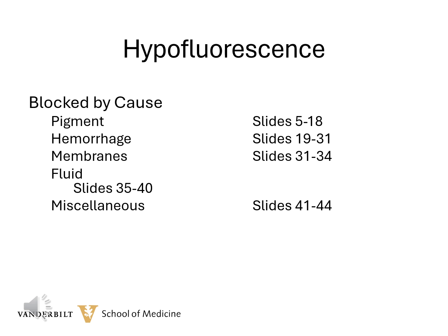So this portion of the atlas on hypofluorescence is organized by the physical findings and then the location. So it's organized more on our thought process. So let's look at the different clinical findings which can cause hypofluorescence secondary to blockage. And we'll begin with pigment because there's normal hypofluorescence centrally in the fovea and is secondary to different kinds of pigment.